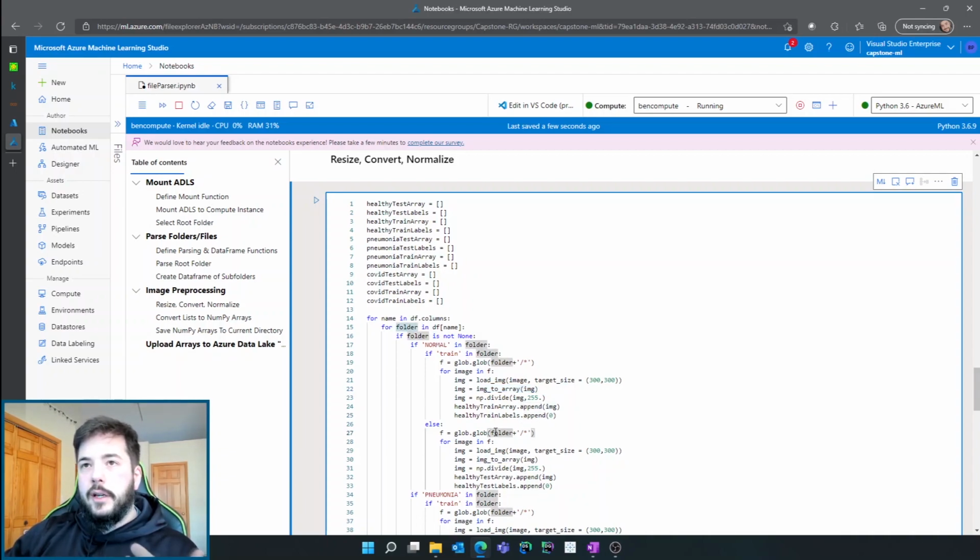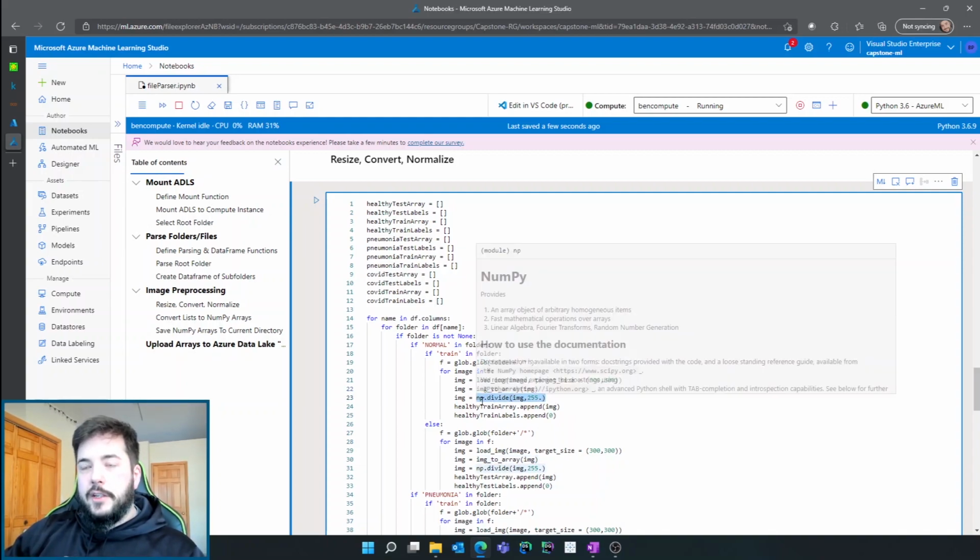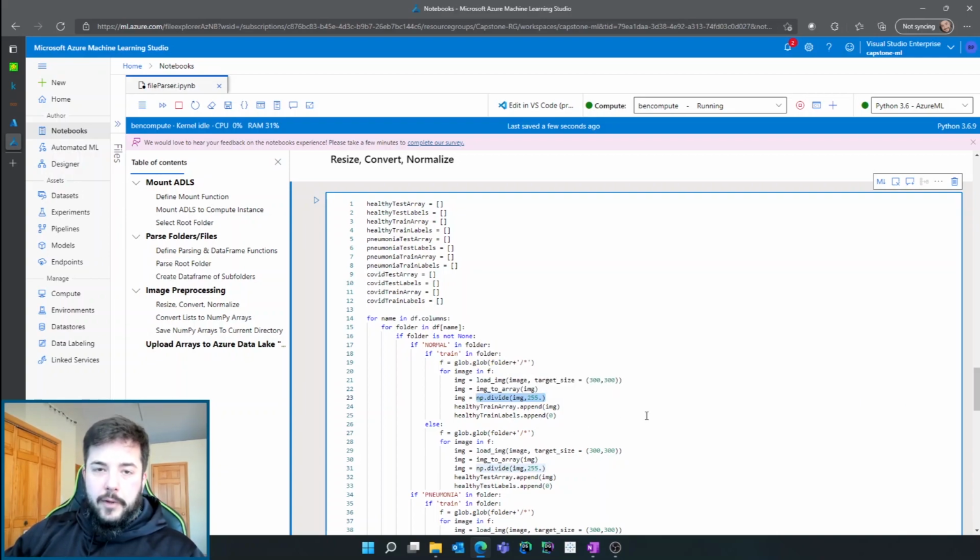If you think of a standard picture, every picture has different pixels in it. Every pixel has a numeric value, typically 0 to 255. Some images that are grayscale only have one layer of pixels with values 0 to 255. If you have a color RGB image, it has 3 different layers. You can treat it as 3 different matrices, each with pixel values, again, 0 to 255. So all we're doing in this case is converting the image to pixel values in a matrix. We're going to divide each pixel value by the maximum value, which is 255.